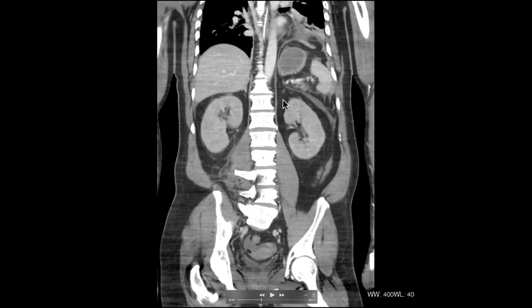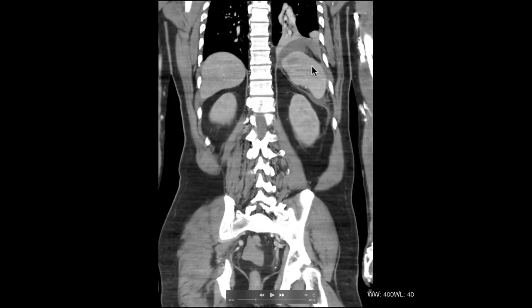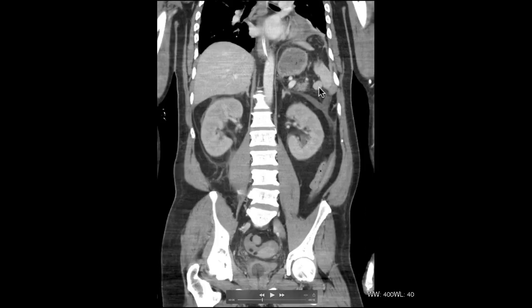No liver lesions. We've looked at the adrenals, they're fine. Kidneys look alright. Spleen there. Occasionally you get splenic infarcts and things, but that looks okay again.